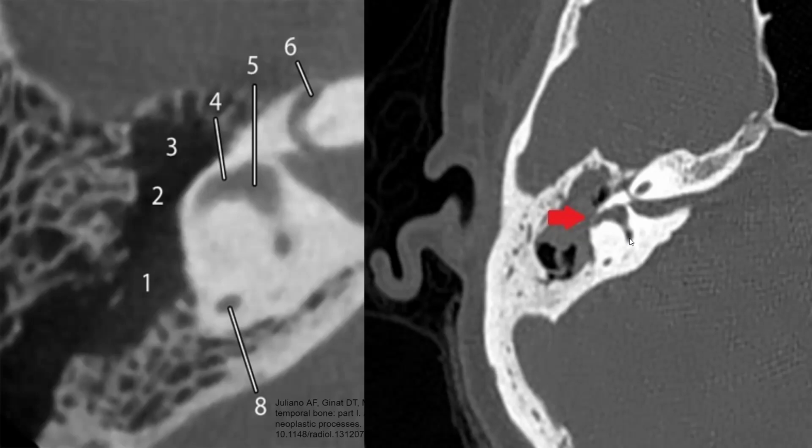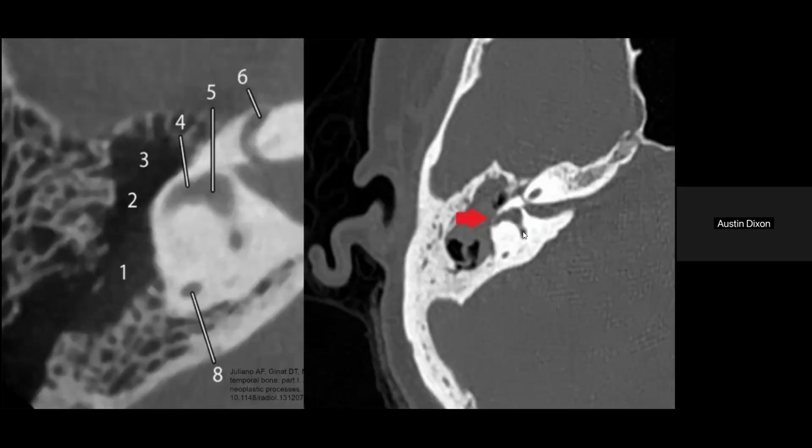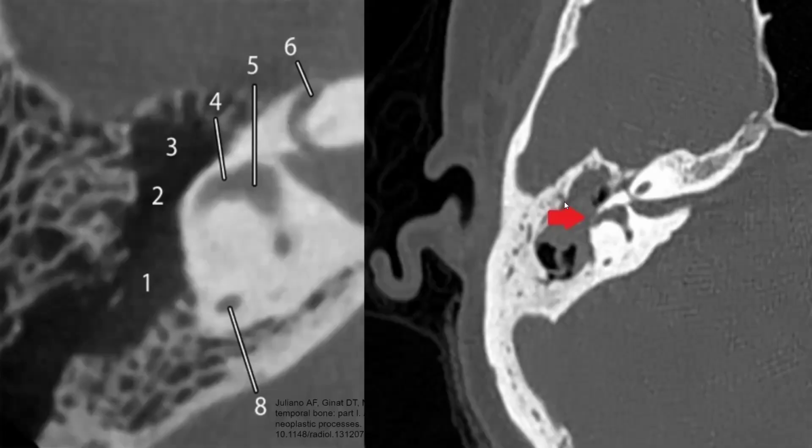When you have a little bit of air in the inner ear and a little bit of fluid in the middle ear cavity, you start thinking that there's an abnormal connection between the two. And in fact, that's what we have going on here. We call this a labyrinthine fistula. Again, the clue is air in the inner ear at the same time that there's fluid in the middle ear. Remember, there should be air in the middle ear and fluid in the inner ear.